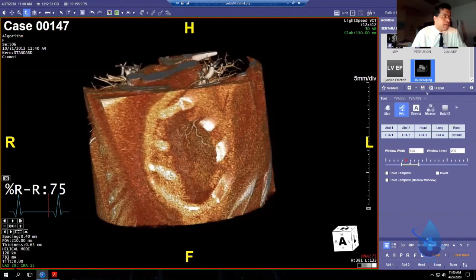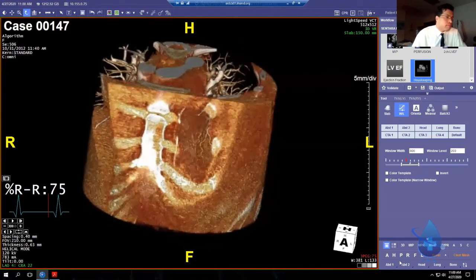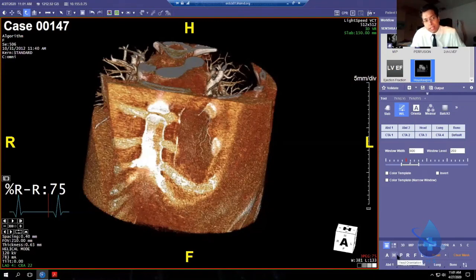And the exact camera angle is listed here in case you need it, if you're thinking like a catheterizer in the cath lab. All right. So these are buttons you need to move. Now, the other thing you can do is just hit the letter on the keyboard.